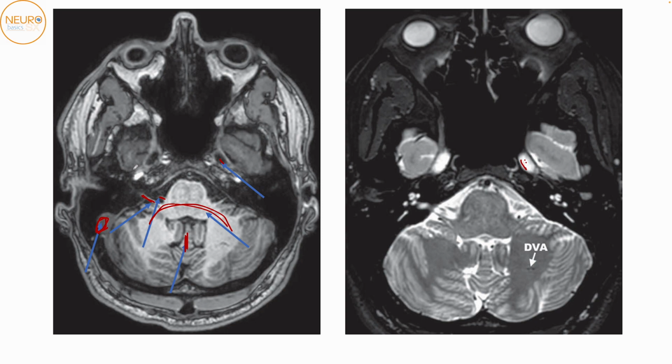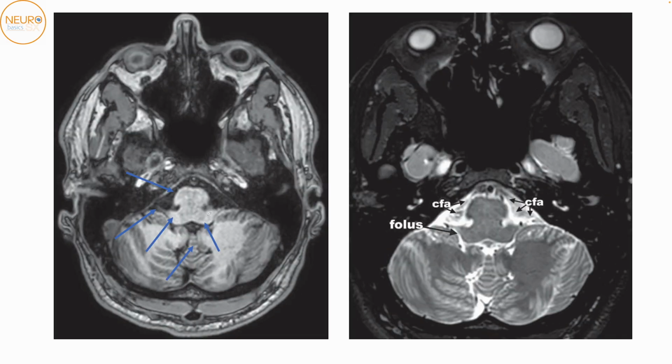Okay. So at the next level, now the pons is starting to form the medulla. Okay, so this part is going to become the medulla. This is the pontomedullary junction. This part is the vestibular area of the medulla. This is the inferior cerebellar peduncle. This again is still showing the 8th nerve to an extent, and this is the cerebellar vermis.